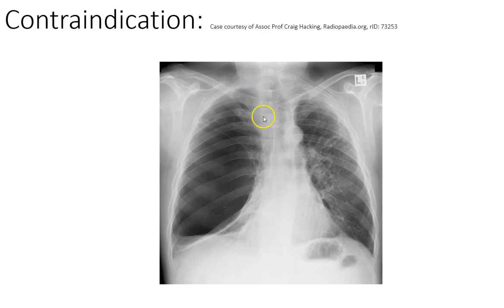So again, spine is central. There's a little bit of rotation. 1, 2, 3, 4, 5, 6, 7. 1, 2, 3, 4, 5, 6, 7, and so this is maybe slightly hyperinflated, this set of lungs. Trying to work out where the hemidiaphragm is, it's not easy. On this side, it is much easier. There is a bit of tenting when you've got this peak, and that suggests that there's sort of chronic fibrosis, or something that's caused fibrosis and the things sticking together, so it's not all nice and smooth.